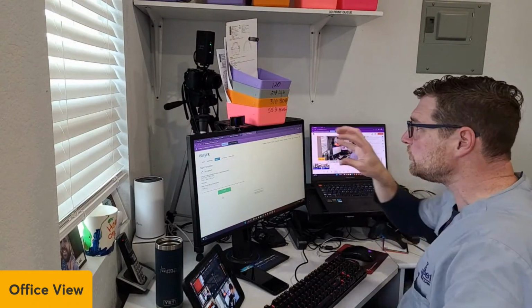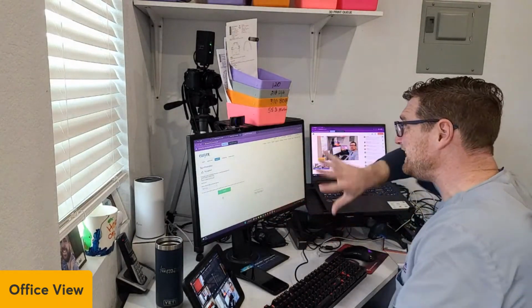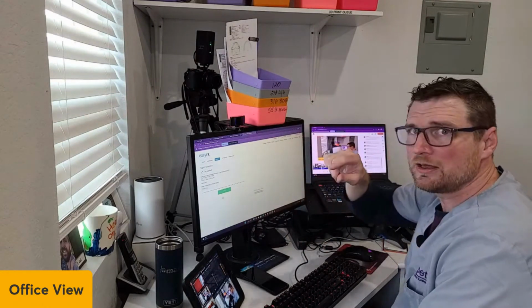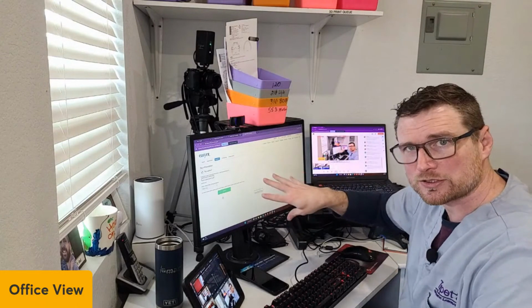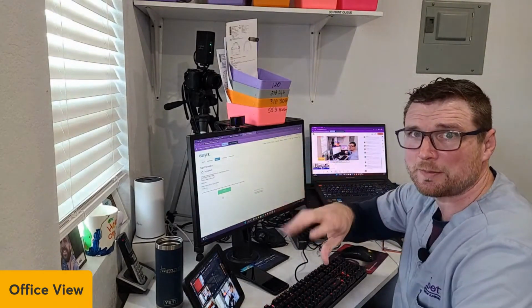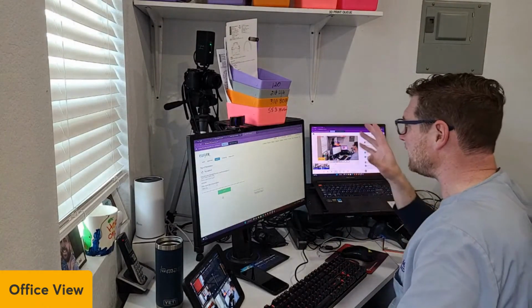Good thing about EasyRx, it's web-based. You can use it on any computer. I use it on a Chromebook, a Mac. It doesn't matter. Now, that feature where I imported it into my nesting software only works on PC as far as I know. It doesn't work on Mac. So just to let you know, if you're trying to do that on a Mac, it doesn't work. I've tried it. It's all about web extensions and stuff like that.